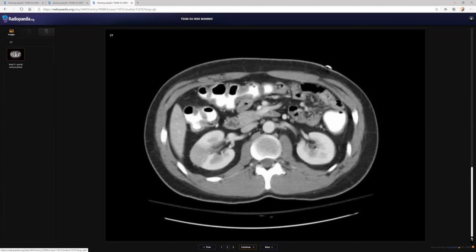I will inform the referring clinician about the findings, that there is a thrombus in the renal vein, and I would like to see whether there is any other area of thrombosis like the IVC or any extension of the thrombosis. And we'll look for the cause, as there is no other cause of renal vein thrombosis except what is noted here.